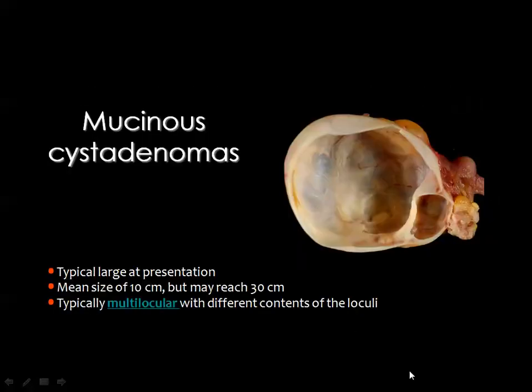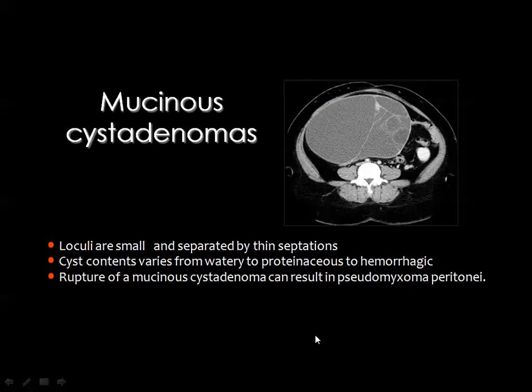The mucinous cystadenoma is characteristically multilocular, and this cyst is also of large size. It can be small or can be large, but the cyst to be differentiated from serous cystadenoma, this cyst contains internal septations and may sometimes contain calcific foci, but if you see mural nodules or masses, this will turn this cystadenoma into the malignant component, which is a mucinous cystadenocarcinoma.